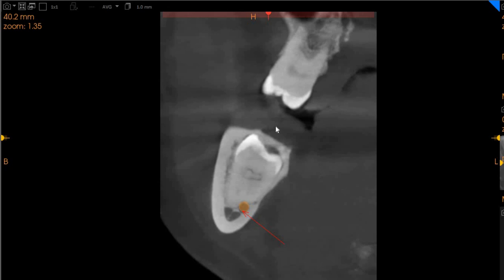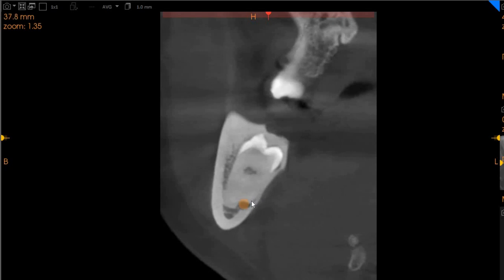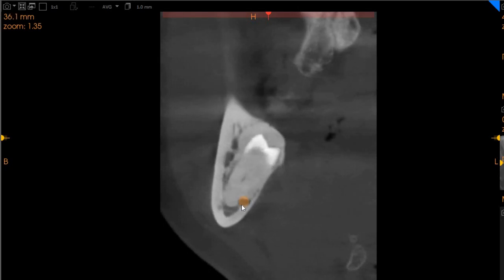This is the lower right hand side. It is not enveloping it, but as you can see, it pretty much covers the inferior alveolar nerve and is also compressing the inferior alveolar nerve from all angles. It has a very thick cortical plate on the superficial aspect. It is very much ankylosed with the cortical plate on the lingual aspect as well as on the buccal aspect.